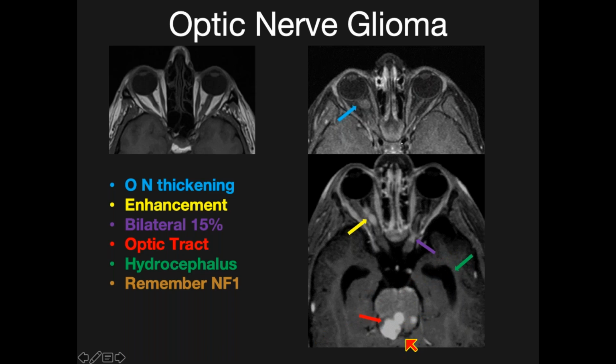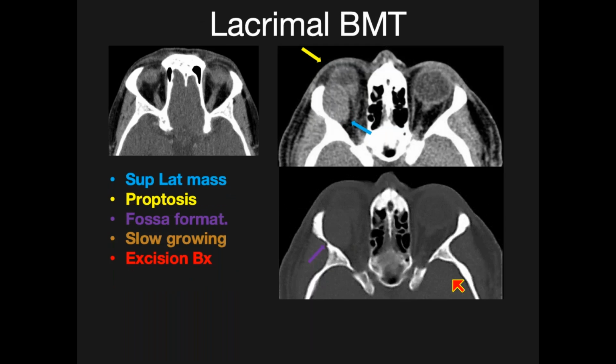This lesion is compressing on the posterior third ventricle and is causing early hydrocephalus here. So patients with optic nerve glioma would not necessarily present with visual problems, they can actually present with problems related to increased intracranial pressure.